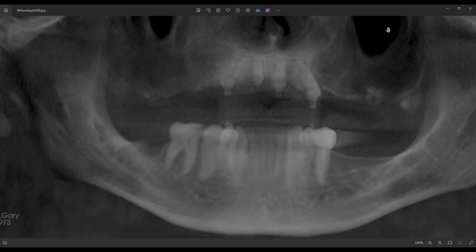If this is all air and I'm placing dental implants in here with just this much bone right here, then this implant's just going to fall out because there's not enough bony support. So what he needs is to have teeth back here and here. He needs a dental implant supporting it here, or even further back, to be able to support this whole prosthesis, right?